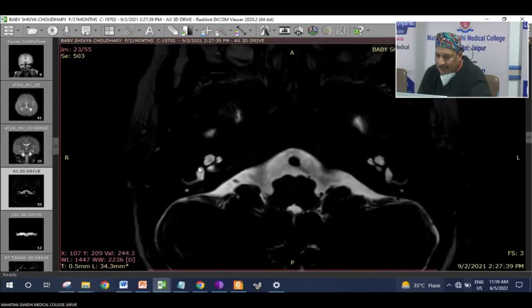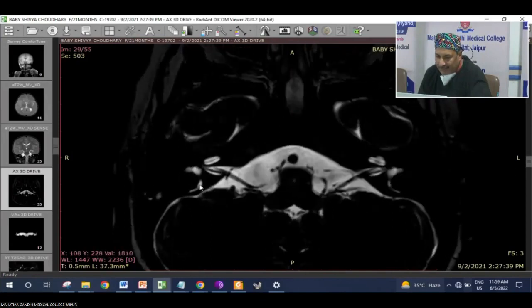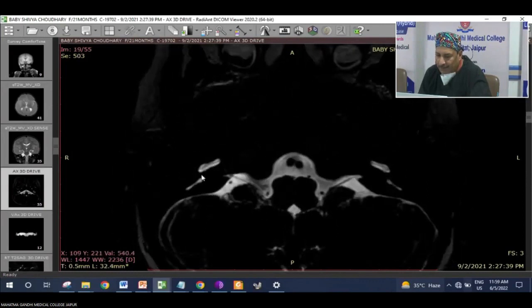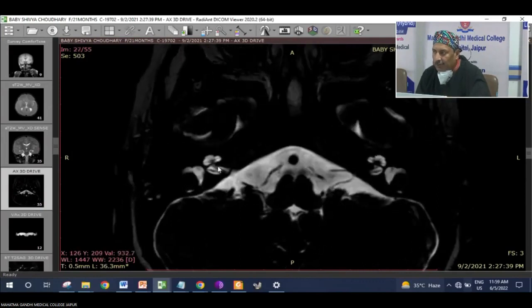That is the vestibular system, the vestibule and the lateral canal. This is the endolymphatic sac and duct. The lateral semicircular canal, vestibule, the basal turn, middle turn, and the apical turn, all full of fluid. This is the prerequisite for a cochlear implant to go.